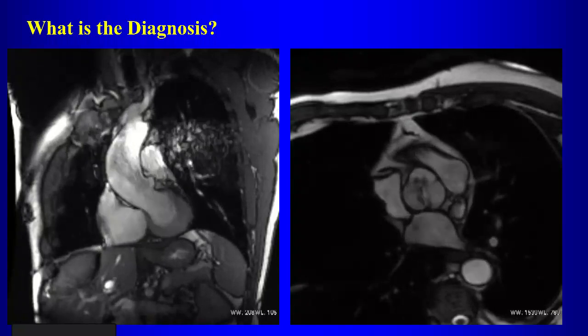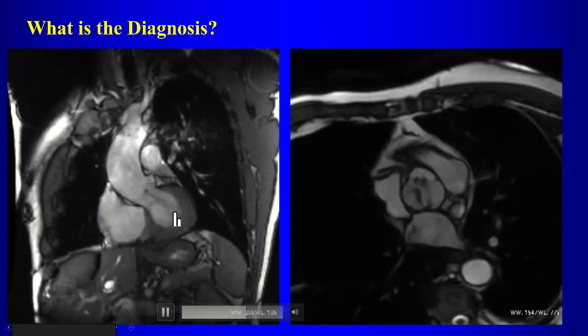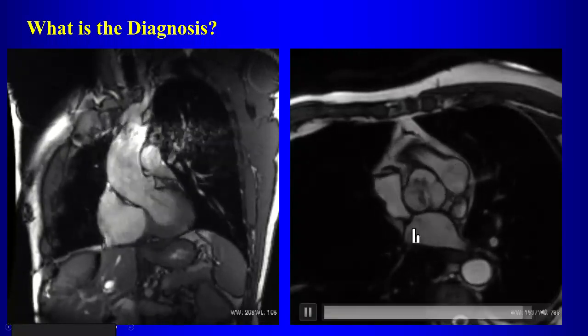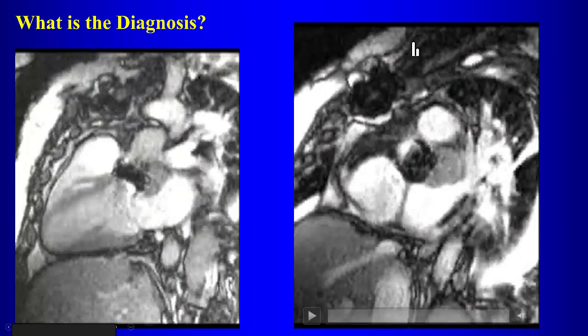It's showing both stenosis and regurg. Yeah, so you can see here on the SPGR that it looks like there is stenosis, and then here on this coronal view, you can see there is also some aortic regurg. What's wrong with the aortic valve? Yeah, it's a bicuspid aortic valve. What's the black stuff? Those are calcifications. Yeah, those are calcifications on the aortic valve.